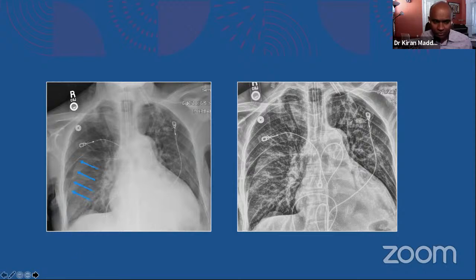So this is a patient with a pitfall in imaging. This is almost similar to the previous case. You see that there's a tiny marking there. But one more thing you have to notice here is that even beyond the marking, you can see some amount of lung parenchyma. This is a classic presentation of a skin fold.